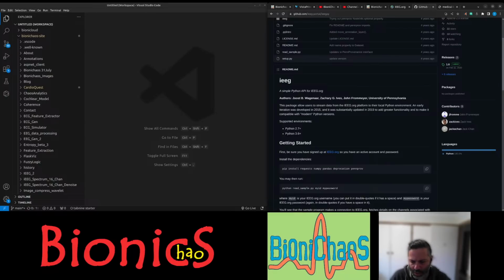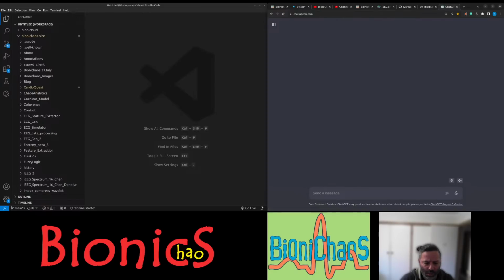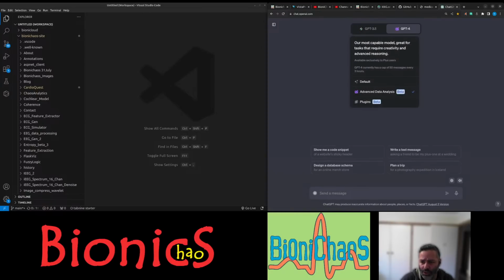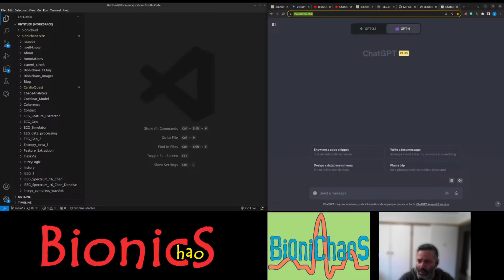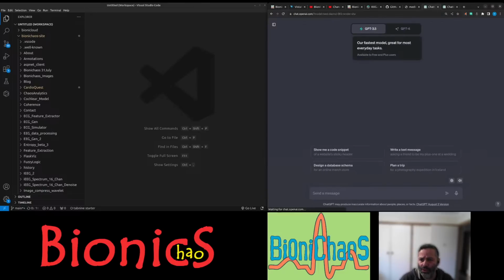So it's using NumPy, pandas. I'm not sure what that is. Some sort of Penn University thing. Just get ChatGPT to help us out. Let's open... I haven't tried this before, really. We open two windows. One we'll have in 3.5 and that one in 4.